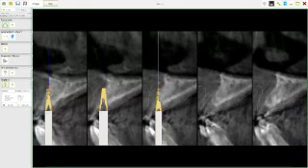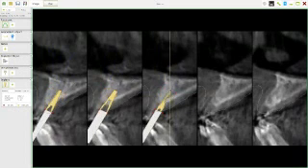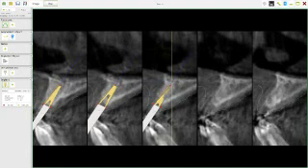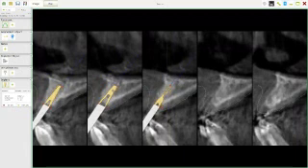So what I'll do is I'm going to slide this around and change it so that it doesn't actually perforate out labially. And I can move this around and move it down and have a little look and see how this is going to look. Right? Yeah. See? So now, you could move it outside. If I moved it out there, it'd obviously be in the labial sulcus. And I could move it there.